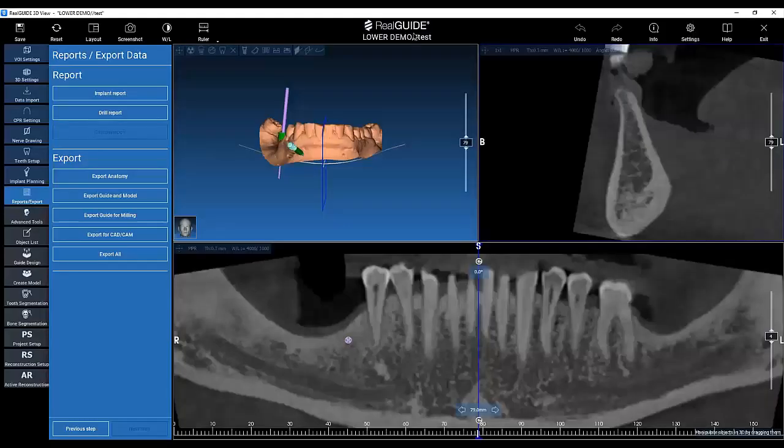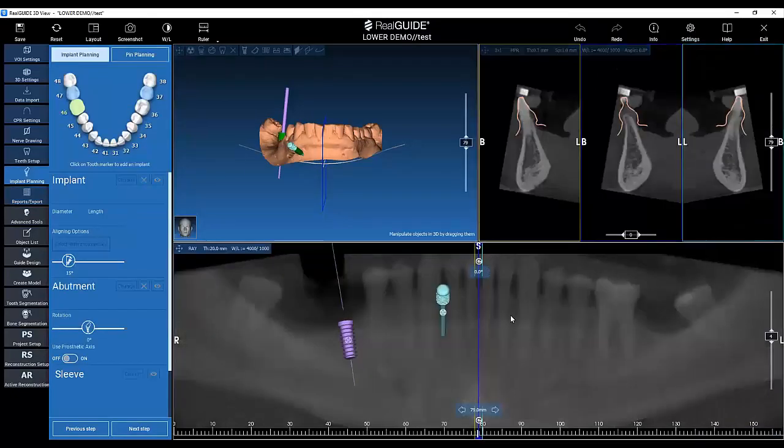Is there the possibility to create a custom sleeve? Yes, you can create the custom sleeve with the tool. Let me show you. You can go in the settings menu here. Can you see my screen, right? Yeah, I see. Settings.